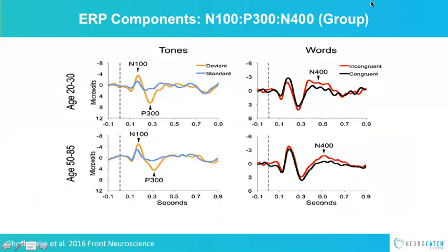So now what I want to do is start with the first of many pictures for you to get familiar with what these responses look like. So we're really training you to be a pattern recognizer. The human brain is the best pattern recognizer there is. We still haven't created artificial intelligence and computers that can rival us. So this module is really about getting used to seeing these responses in their raw brainwave format.